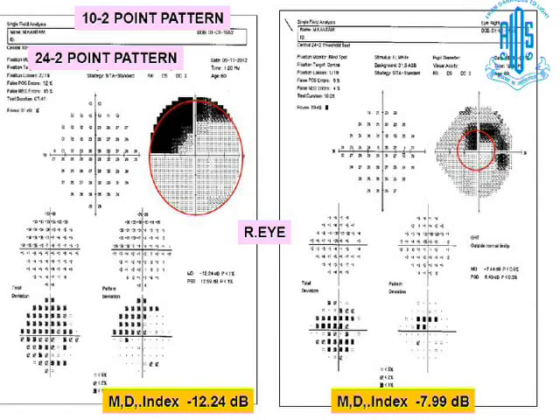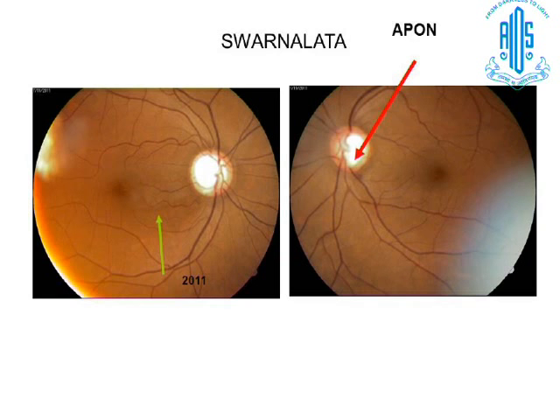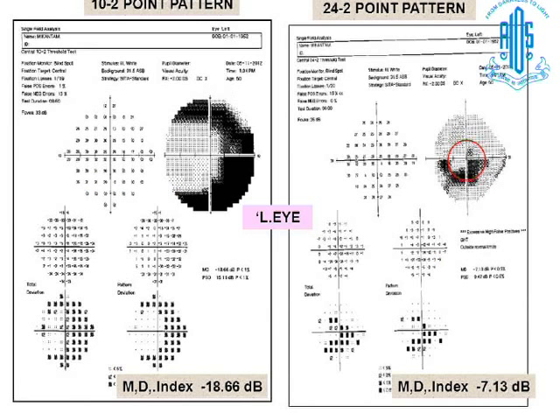So this is the disease. Most important is examination of the 10-2, because I suspected it as the defect is going almost near the fixation. The defect sometimes will be like this, sometimes it comes like this. The other eye, you see, is still more dangerous. Even in 10-2, they are following the arcade pattern. There is no blind spot, but they are following the arcade pattern.